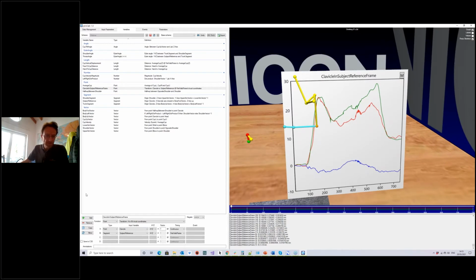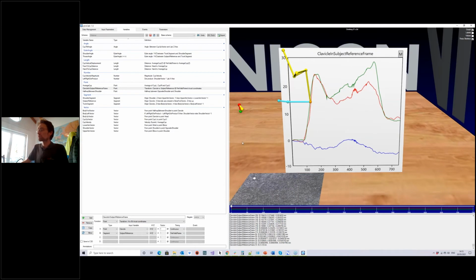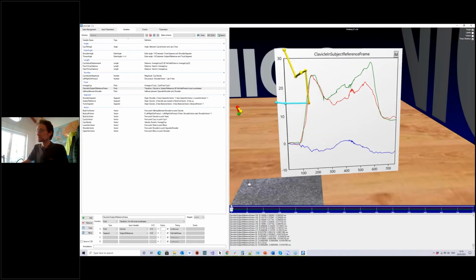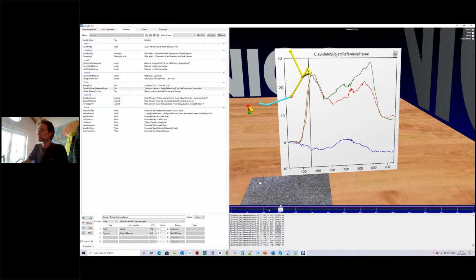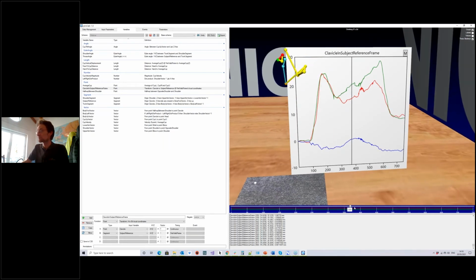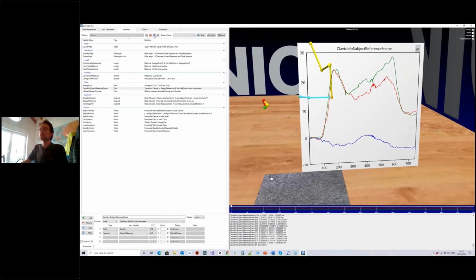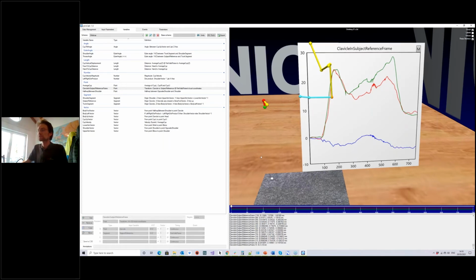Right, so this essentially are all the variables that I need in order to start generating events. Events are going to be very crucial here because I don't want to sit in Nexus, unless you could, of course, sit in Nexus and manually identify this is when the subject grabs the cup, this is when the subject starts to drink, etc. But this can be automated in ProCalc, and that's the next step that we're trying to do here. So I'm going to save this scheme.